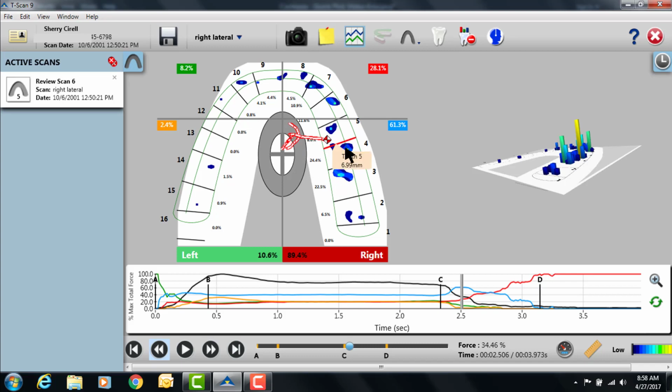A quick adjustment in these areas may result in a quicker movement. When we play this movie a little bit more, the idea is that this little corner that's created could be a smooth transition directly to that if we were to adjust some of these interferences between 1 and 5.